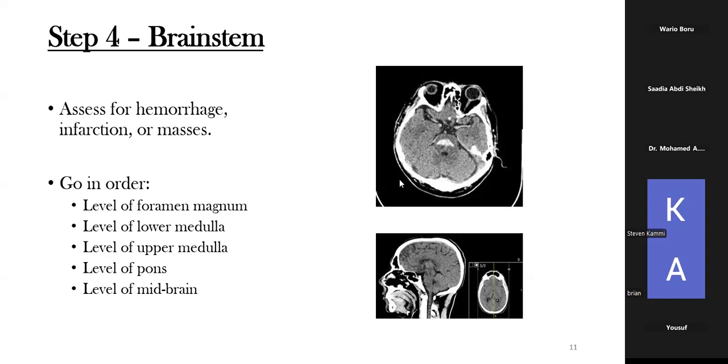Recap the pre and post contrast. So pre and post contrast, how do you differentiate between the two? The easiest way is if you look at the scan, sometimes here at the bottom, it's written contrast. So then you know it's a post contrast scan. Or some will write for you pre-contrast, you know that's a pre-contrast scan. However, some people do not write whether it's pre or post contrast.